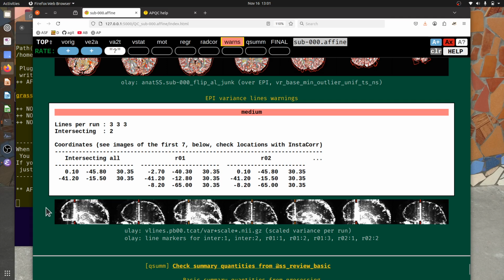If you take the volumetric map and you calculate the variance at every location, and then you look at it, let's say sagittally, in some data sets, you'll find that there's just a bright, narrow column of high variance. Now, there's high variance around the edge because of subject motion. There may be high variance in the middle because of weaker signal strength. This is pretty common, but it's these very vertical features here, and they're highlighted by where this automatic detection program found them, by these little red overlay lines showing the top and bottom.